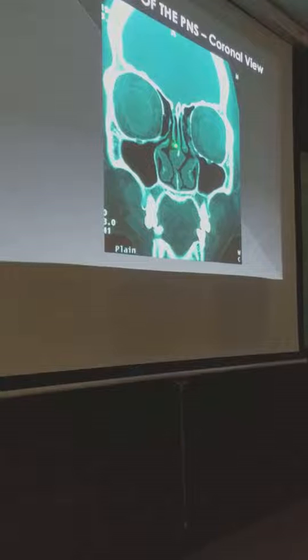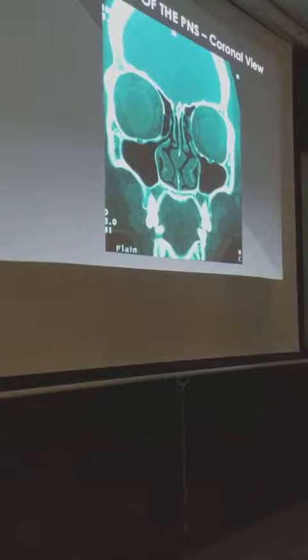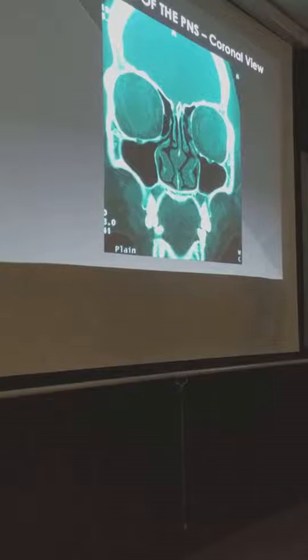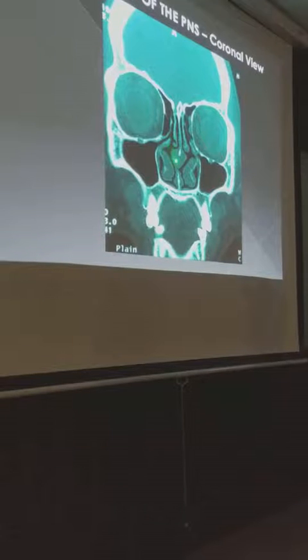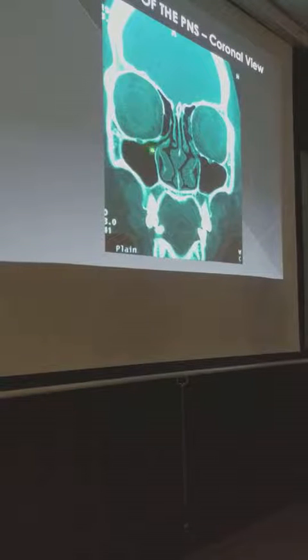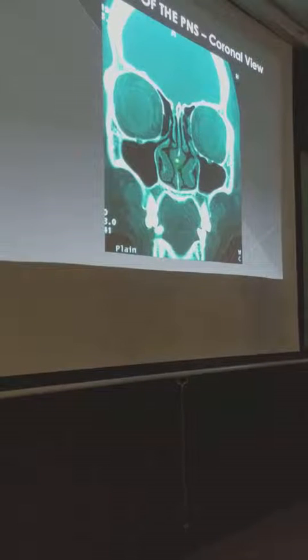Okay? So when you do your uncinectomy, you are already doing your infundibulotomy, because you're actually opening the medial boundary of your infundibulum. The lateral boundary of your infundibulum would be this. What's this? That's your lamina. Di ba? The medial boundary would be this, which is your uncinate. So when you do your uncinectomy, infundibulotomy na rin yan.